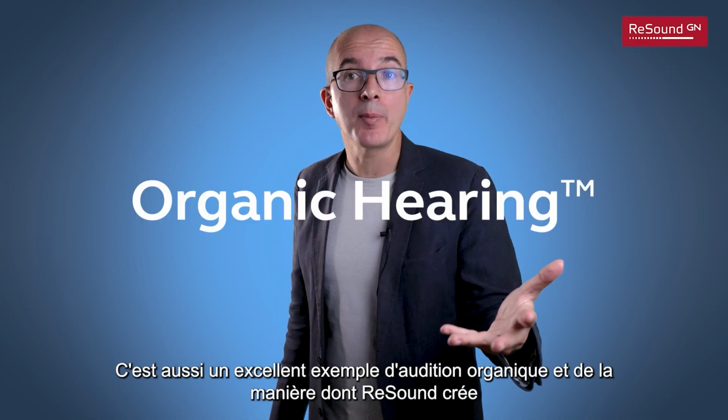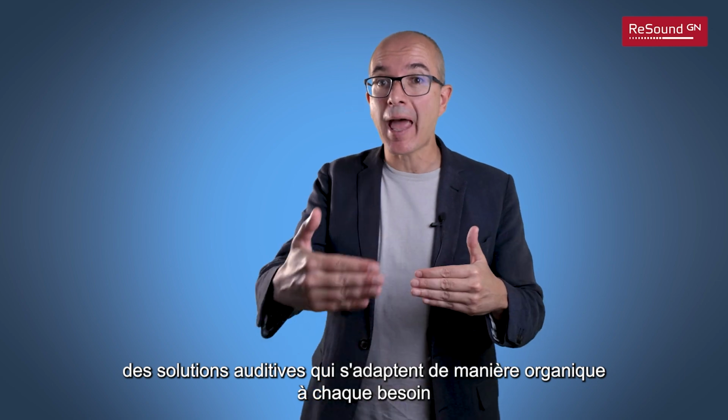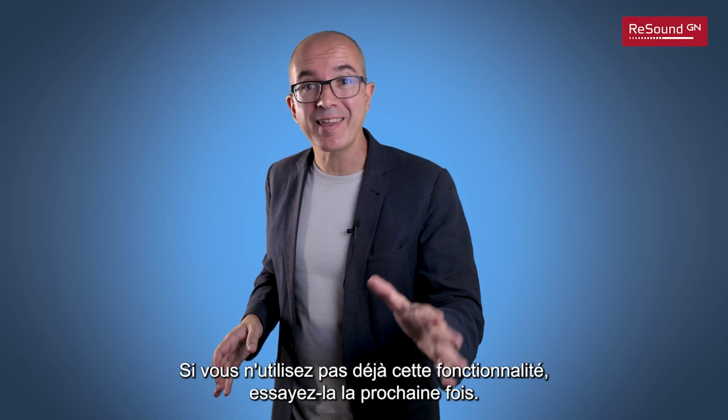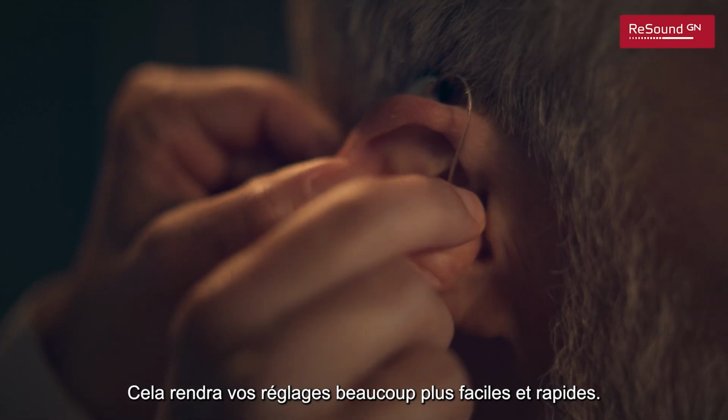It's also a great example of organic hearing and how ReSound creates hearing solutions that adapt organically to every need, rather than people having to adapt to their technology. If you are not using this feature already, give it a try next time. It's going to make your fitting so much easier and faster.